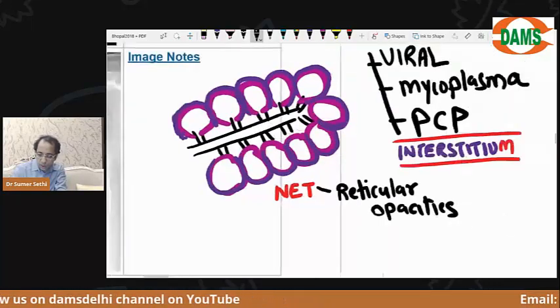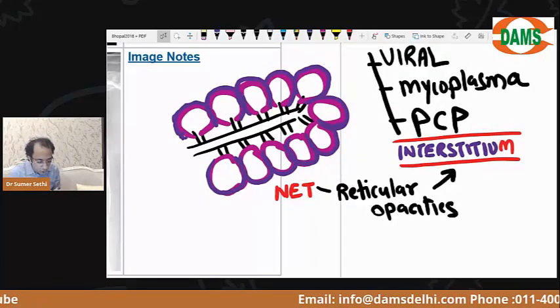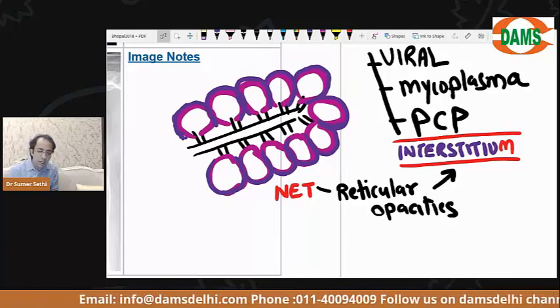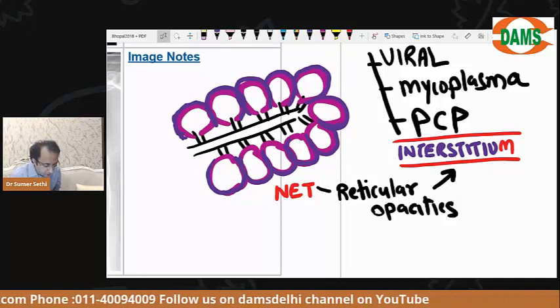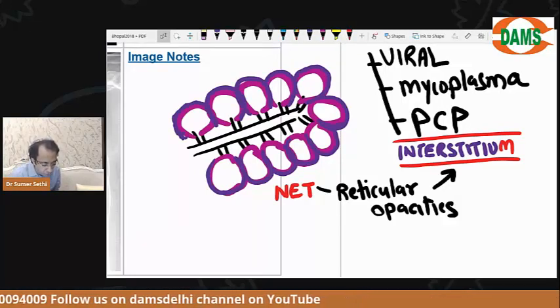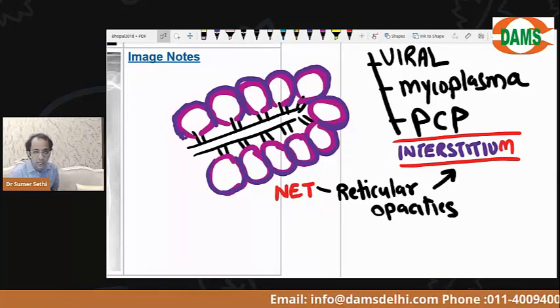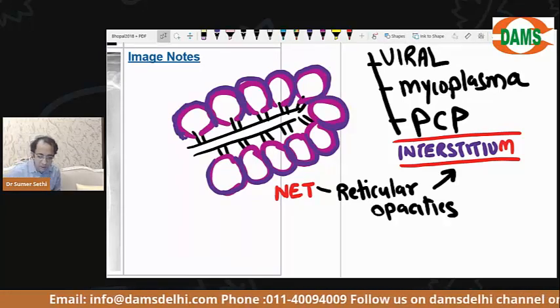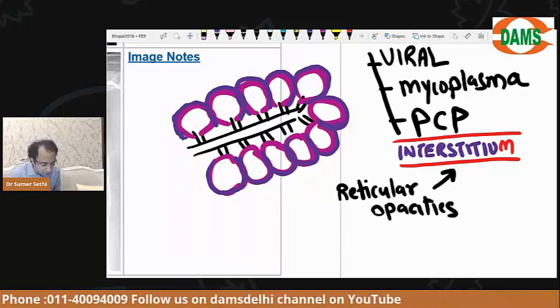The only thing I want you to understand is whenever I say reticular opacity on a chest X-ray, I will mean interstitial opacity. Are you clear? PCP means pneumocystis pneumonia, beta. Where have you heard of pneumocystis pneumonia? You have heard of it in AIDS patients. Now, because COVID came, we have all forgotten all other infections, but don't forget other infections also exist.